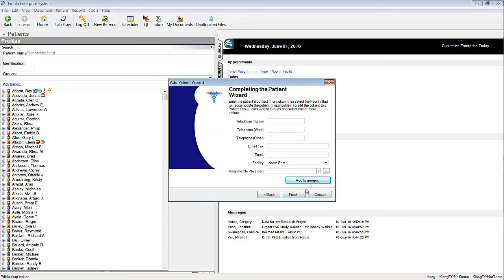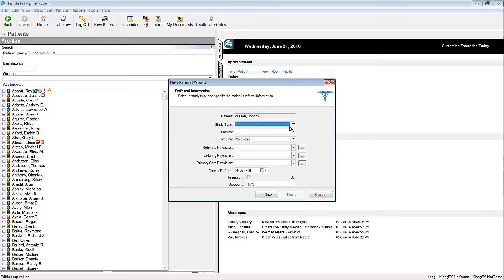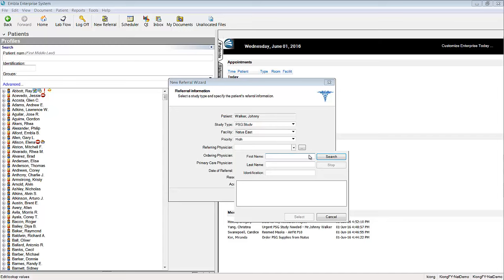Please note that throughout this demo, you will see the two facilities, Natus East and Natus West, but I already made some modifications so that you will see only Natus East as the facility. I'll click finish. Here they will guide you on what kind of study you want to do for this patient. For example, I want to do a PSG study, high priority. This is the patient of Dr. Christina.